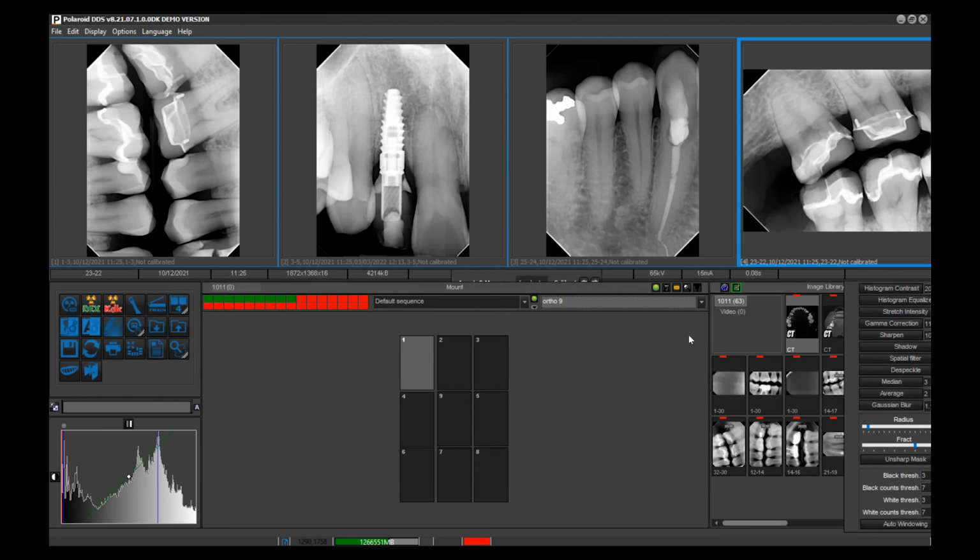So, what am I missing, Bob? That's pretty much it. That's all the basics.